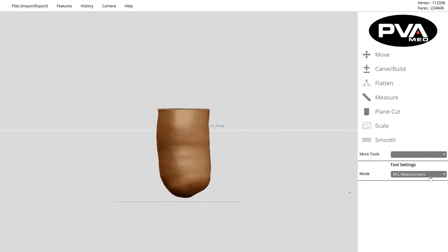You can also use the point-to-point measurement tool, which is handy. So from one point to another arbitrary point, and then once we've selected the arbitrary points, the distance will be shown in the upper right-hand corner. There are height tool measurements that are valuable, and we'll use the height tool later on when we add a distal attachment in a creative way.